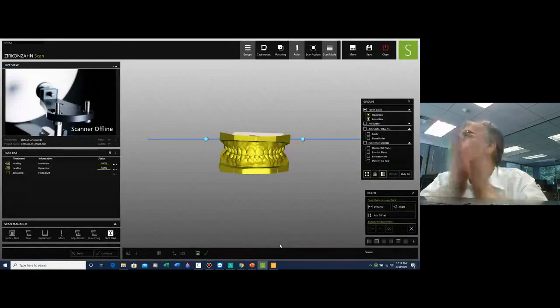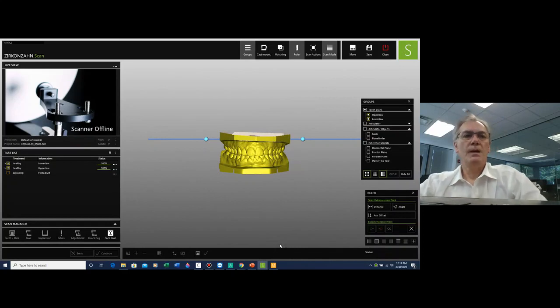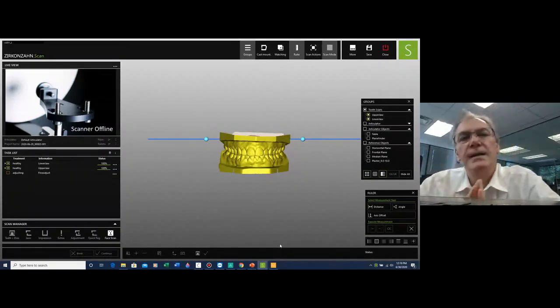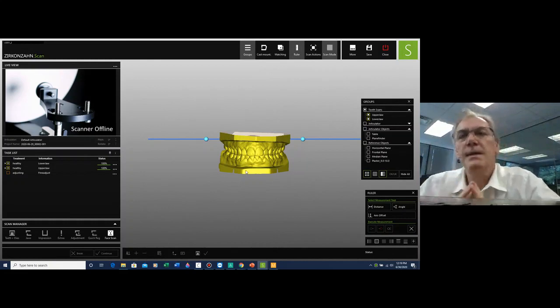Right. Are we back on track? We're back on track and back into our gypsum room in our scan software where we left off the last time. We have our two models mounted into the articulator. Last time we mounted them by utilizing standard data, and today we are going to add the elements that will customize the actual mount into the articulator.